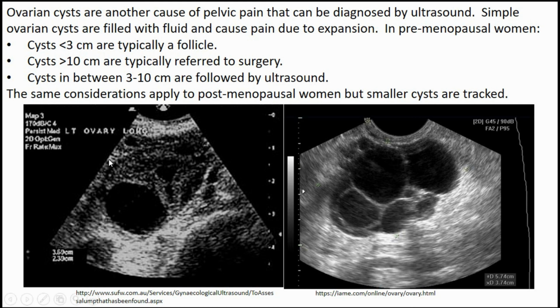Now, ovarian cysts can have a variety of appearances. Generally, they tend to be fluid-filled pouches, and right here we can see, instead of a nice, relatively solid ovary, we've got lots of fluid-filled spaces here. One characteristic of fluid on ultrasound is it causes enhancement posterior. Because fluid transmits sound waves so well, it actually enhances the area behind it. So that's why we have this nice bright area just past all these fluid-filled spaces.